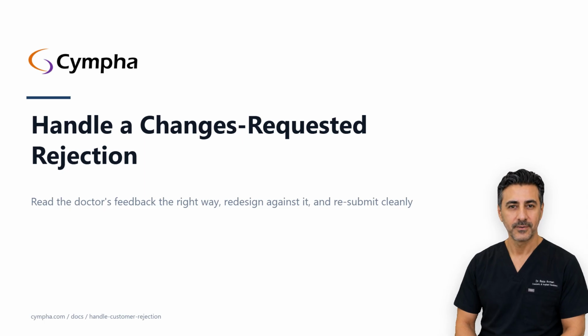By the end you'll know how to spot a return case on your dashboard, how to read the doctor's feedback, which lives in completely different places for AlignerBot cases versus everything else, how to redesign against it, and how to resubmit cleanly. Budget about 6 minutes for the mechanics, plus however long the redesign itself takes. Follow along, or listen now and read the written guide later.